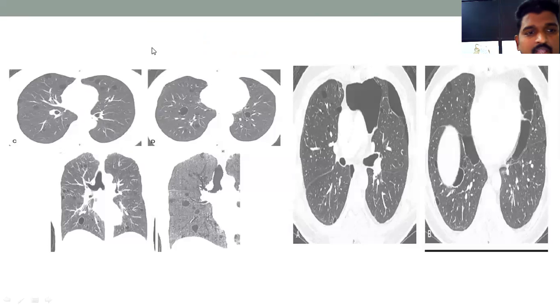Once again, this is one of the cysts. You could see the cyst wall is also very thin, and the cysts are evenly sized, and sparse. You don't find a lot of cysts in the lung. There are sparsely spaced cysts, and these cysts actually abut the vessels close to them. This is very classically seen in Sjogren syndrome. If you see cysts along with ground glass and reticular opacity, against a background of symptoms of Sjogren's, you could think of LIP, even without the diagnosis. This is lymphocytic interstitial pneumonia, that is LIP, that you see in Sjogren syndrome.